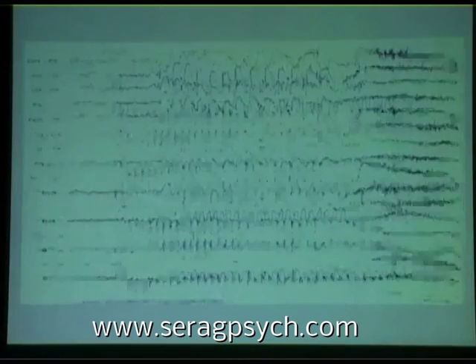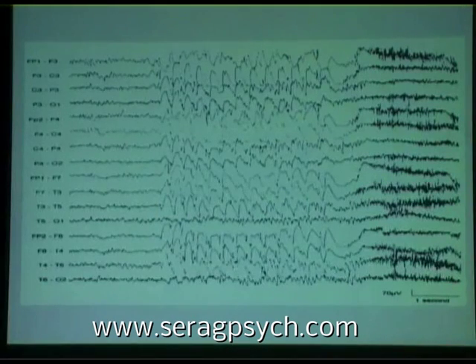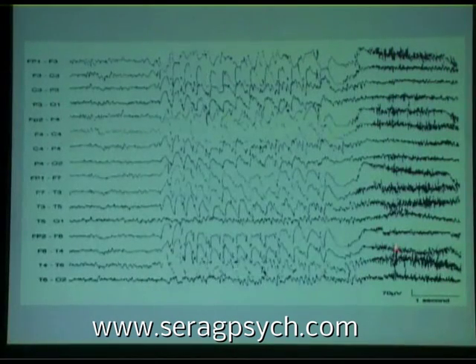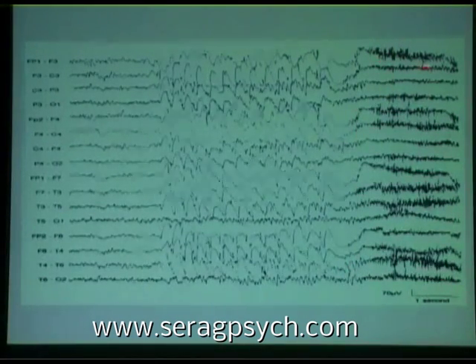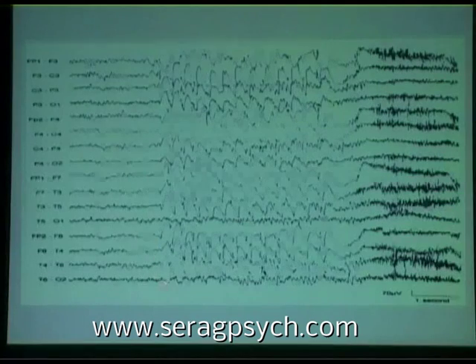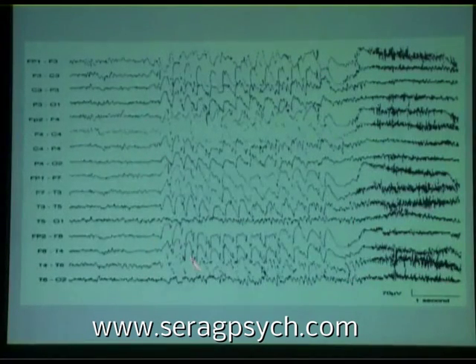Next, please. Now, here's an interesting situation, and the quality is an old slide, but the message is clear. This is what's going to become a generalized tonic-clonic seizure, as evidenced by all the muscle activity here, okay? However, if every time the patient is going to have a generalized tonic-clonic seizure it is preceded by spike wave discharges, which really is an absence attack, then if you have trouble controlling these generalized tonic-clonic seizures, you might use a drug that'll stop absence, like Zarontin.